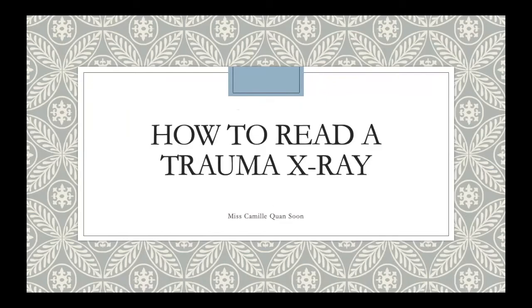Hello students, this lesson is on how to read a trauma X-ray. In the last lesson, you were taught the basics of reading any orthopedic X-ray. You were taught the systematic ABCs approach and a series of questions that we use to communicate the X-ray findings to our colleagues. So this lesson, we're going to concentrate on trauma X-rays and how to describe fractures, subluxations, and dislocations.